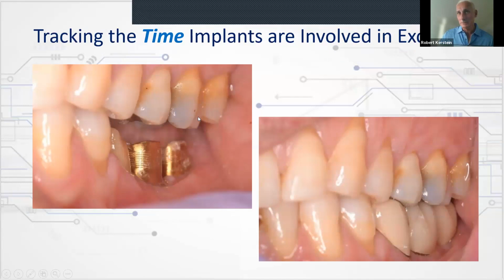So they worsen muscle activity levels when there's long disclusion with implants against natural teeth. They flex teeth on their axis much more when they're against implants if there's prolonged disclusion. So this is a really good example of a place that we can use tooth timing to look at the two crowns that are on this case that are on implants.